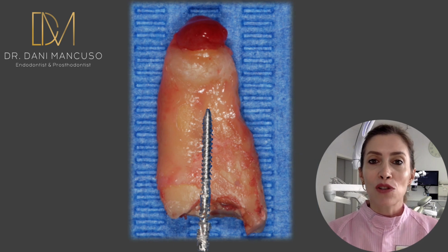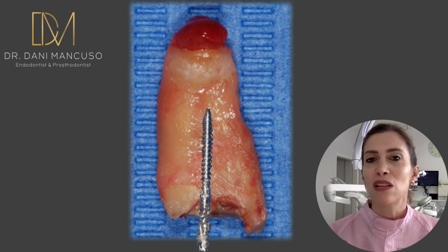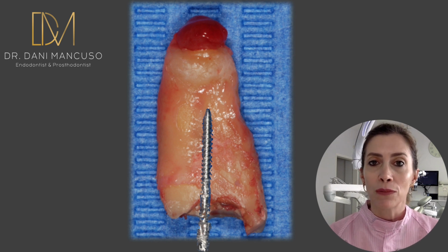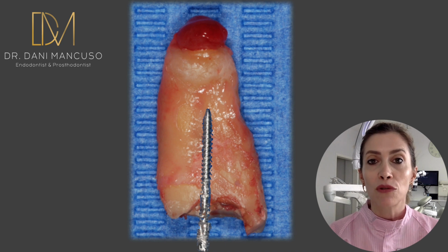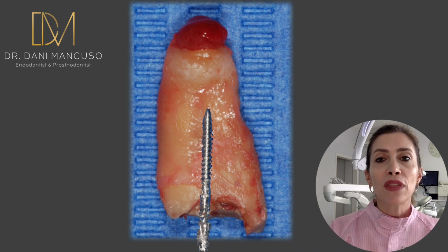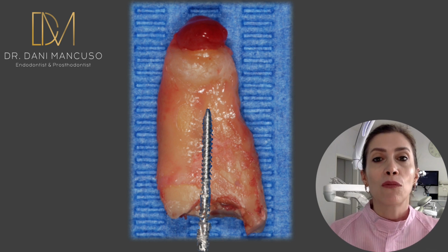Well, unfortunately, because of the severe decay, the gross caries in this area, we had to extract that tooth, but not because of that radicular radiolucency. It was just because the tooth wouldn't be able to take a new post, a new crown. It would have failed very soon. There was a small crack line going into the post area, so we thought that it wouldn't be worth treating it. But if you think about the post, was it positioned centrally like it looked like in the previous x-ray?